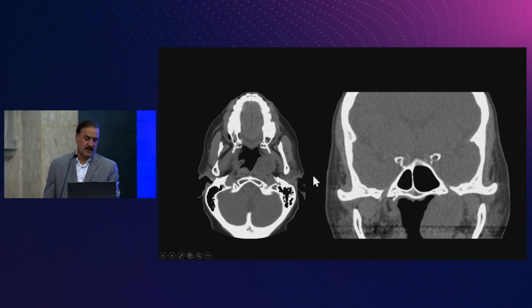And this is sometimes, as I said, you do these CTs, you pick these up, but then you have to go to the MRI to check this out. So here, looks like everything is retained by the pharyngobasilar fascia. I do not have widening of my foramen ovale on this CT.